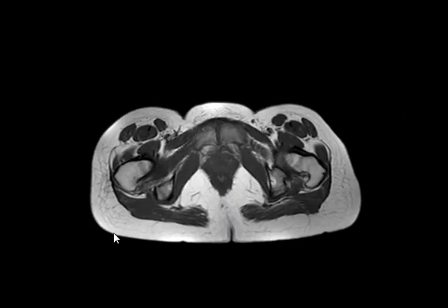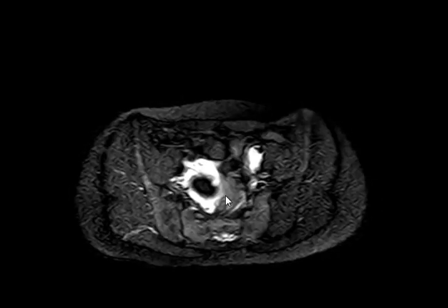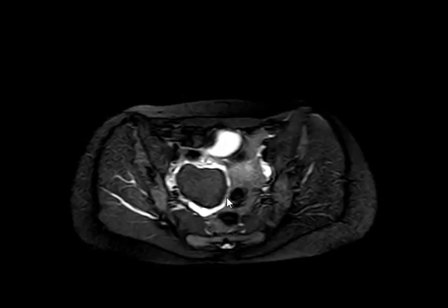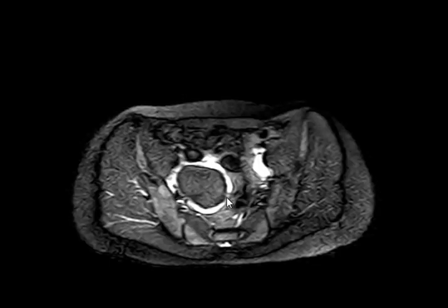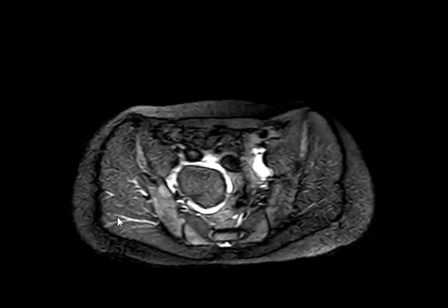So this will be more in favor of infected or complicated. And if we have lymph nodes and free fluid, we have the addition of possible immature teratoma. You should keep it in mind, which is a malignant teratoma.